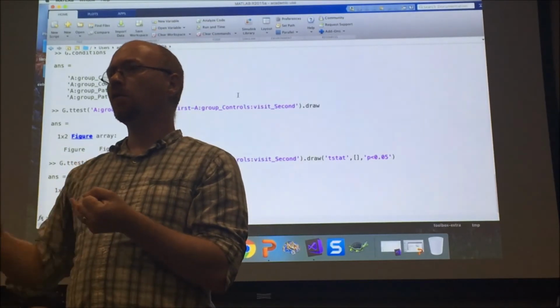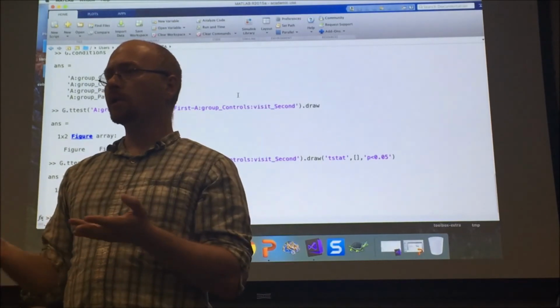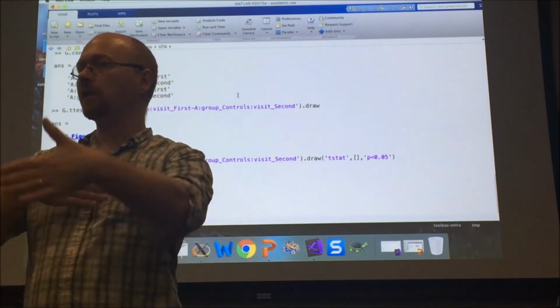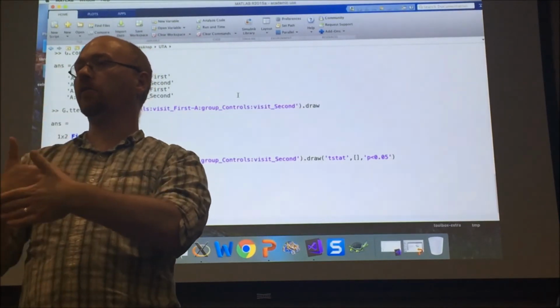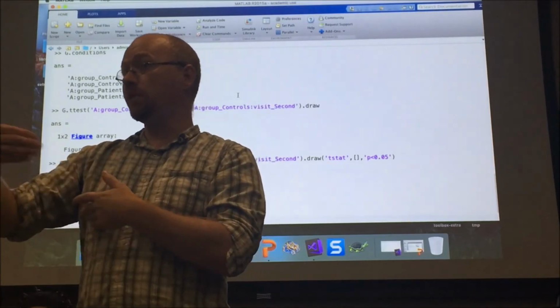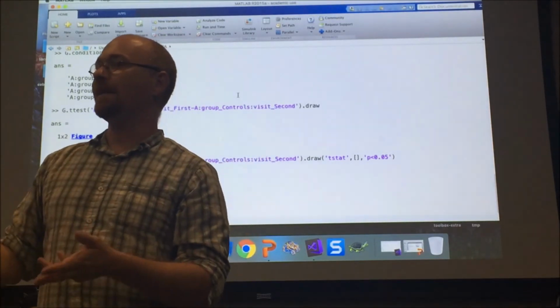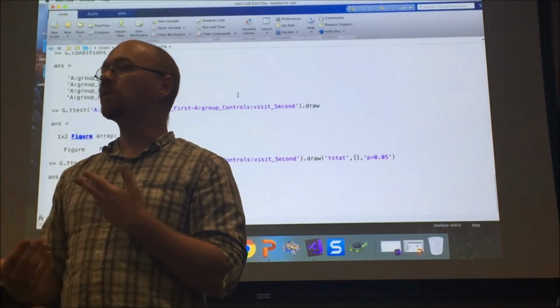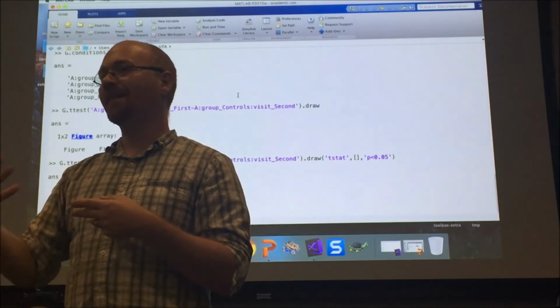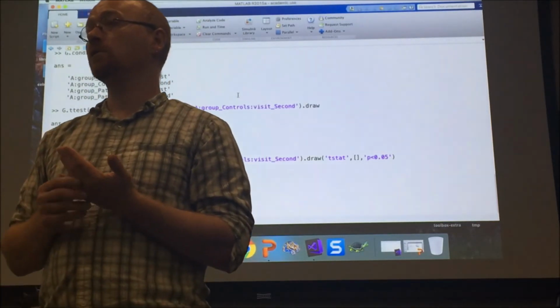So with this kind of analysis right now, obviously we don't have structural anatomy, so we're assuming the probe is over the same location in each subject, and we're just averaging all channel 1s together and all channel 2s together. But you recognize that that's not entirely accurate, and if I'm doing something like child development where the head's growing, that's not going to be sufficient to address certain types of questions.